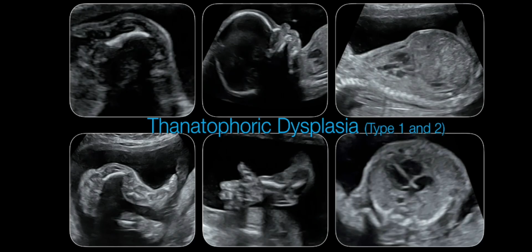So, the last one I want to finish with, and I'm still on time, is thanatophoric dysplasia. I added this morning because yesterday in the session we had from Dr. Mitta from Vienna cases showing that you see it on MR very well, and on achondroplasia. So this is a diagnosis very well known for us, but it could be interesting for you to exercise your skill on looking at the gyration of the brain.